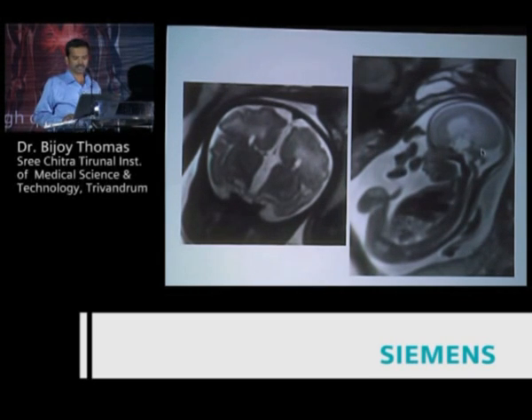Has anybody diagnosed this case? Dandy-Walker? No, it's not really Dandy-Walker. You can see a large posterior CSF space, but a C-shaped brainstem, which is very characteristic of Walker-Warburg syndrome. It's a congenital muscular dystrophy. You can also see that cortical abnormalities will be present in these cases.